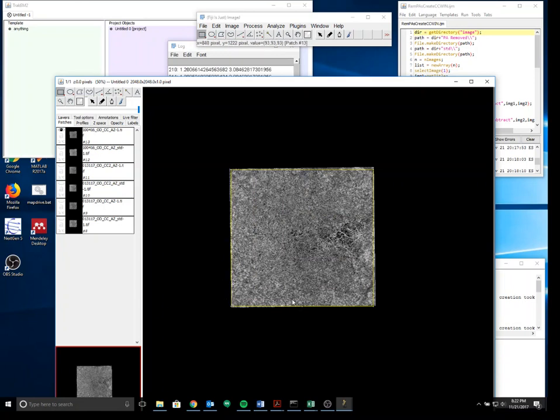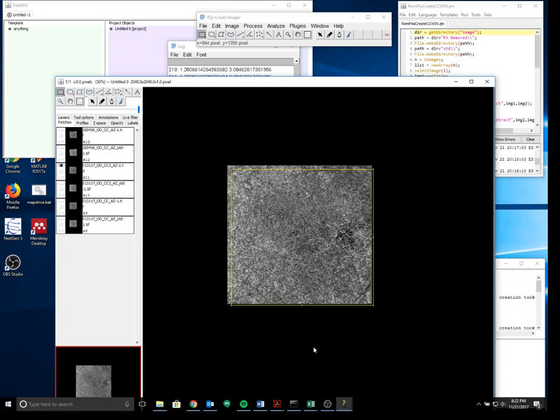And so I like to make sure that each corner is touching an edge, and then there are these little white boxes that I can use to adjust. So now that I've done that, I'm going to click on the next one, make sure nothing's peeking out, which it isn't, and then now this one. And you'll see it's peeking out down here very slightly. It might be tough to see on the screen for you, but I'm going to pinch it up, and I'm going to pinch it in, and then we're going to keep going and repeat this process. Okay, that's fine.